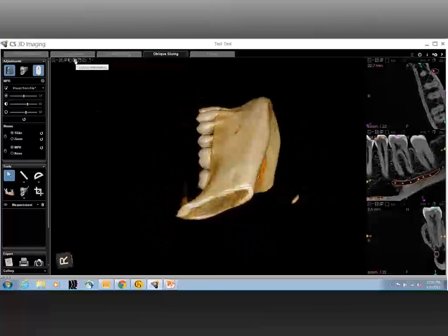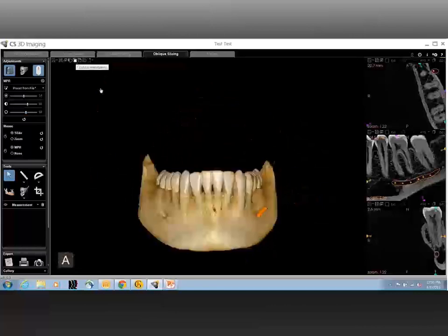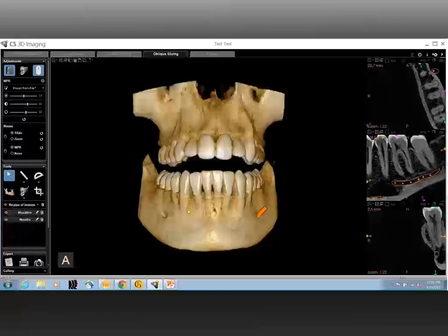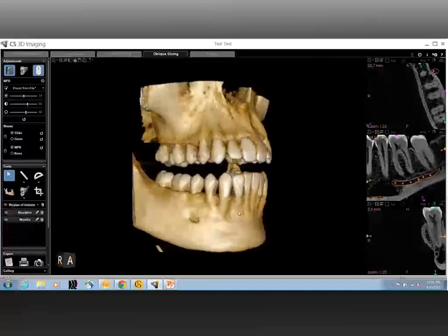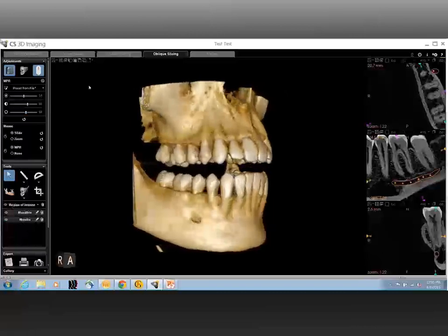And on a more serious note, carotid atheromas. In a slightly larger field of view where you can capture up to the angle of the mandible and the ascending ramus of the mandible, you would possibly be able to see even carotid atheromas if they are present. It should also be noted that carotid atheromas may be visualized even on a two-dimensional panoramic and not just on a three-dimensional scan.